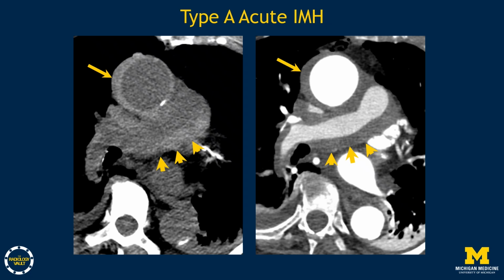The ascending thoracic aorta and the pulmonary artery share a common adventitial sheath, and when there is a subadventitial rupture of the ascending thoracic aorta, blood can seep into this common sheath, and it can be of varying amount and can even compress the pulmonary artery.